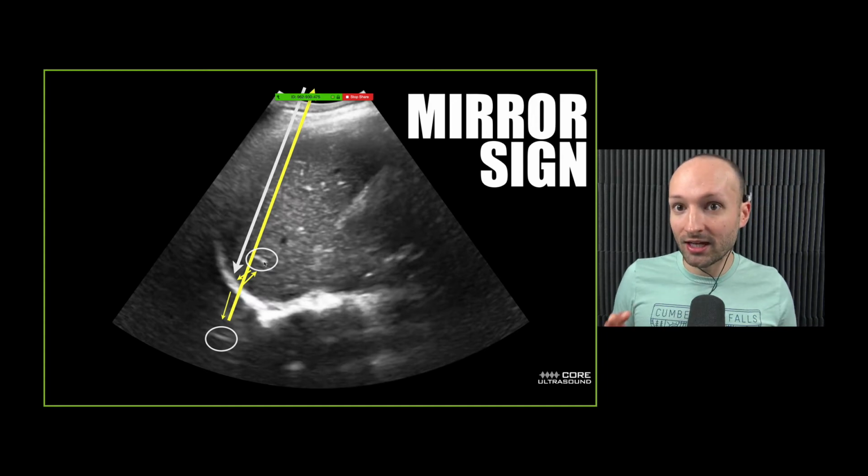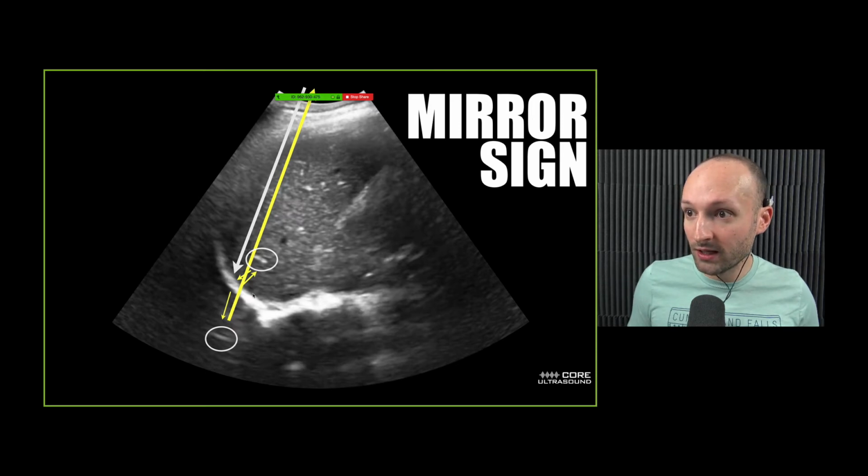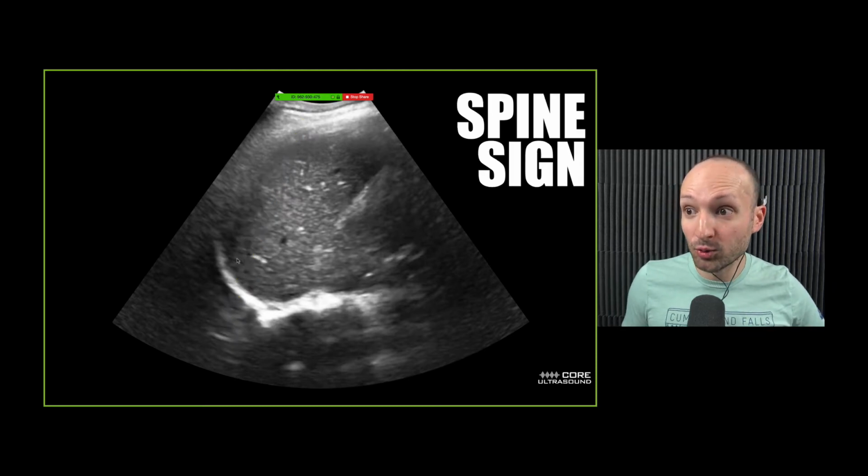All that to say that if you see identical or very similar echo texture above the diaphragm as you see below the diaphragm, that means that the thorax is air-filled, not fluid-filled.